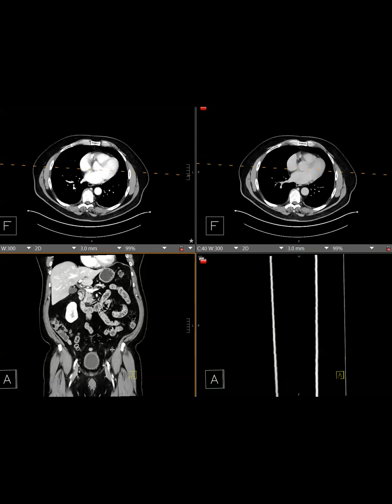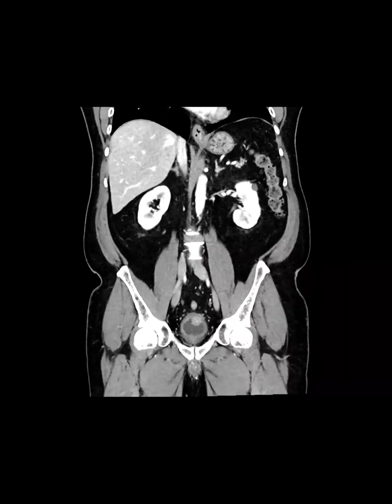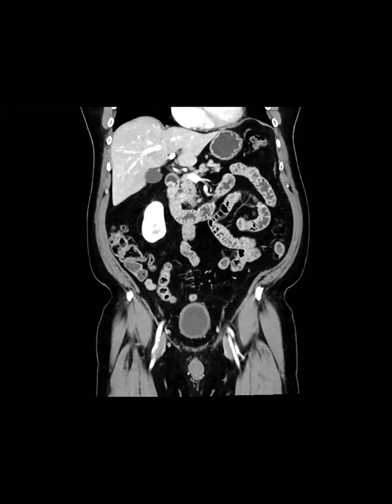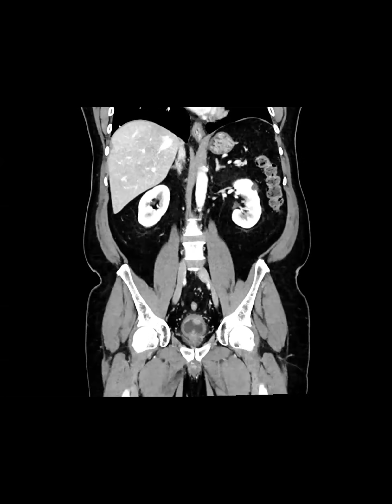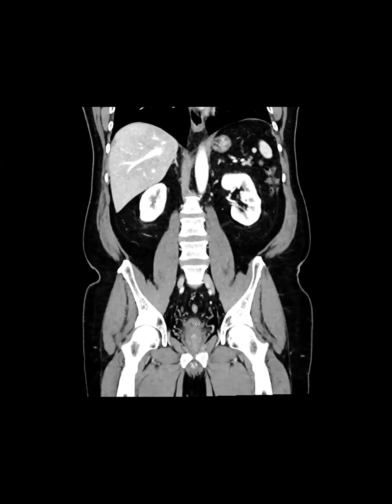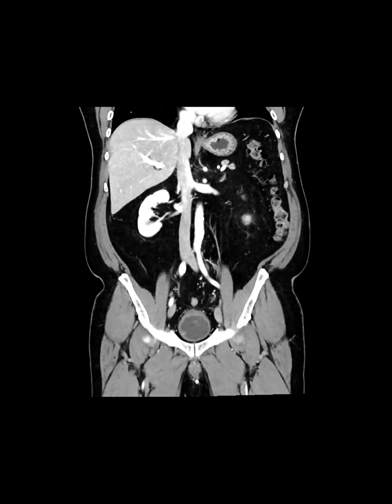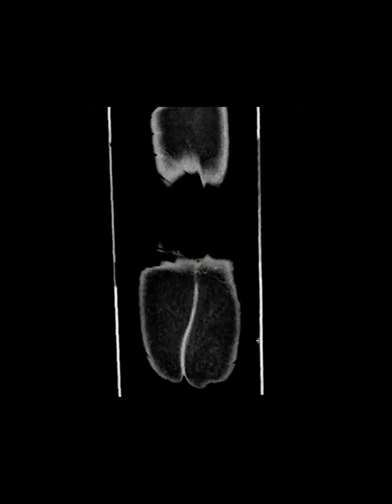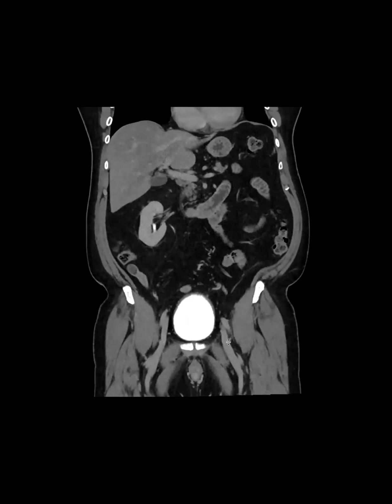Okay, go. This is the patient with hematuria and had a standard CTU. So on the nephrographic phase, we see multifocal papillary bladder lesions. And the upper tracts were clear, and then on the urographic phase, we see the filling defects there, corresponding to the site.